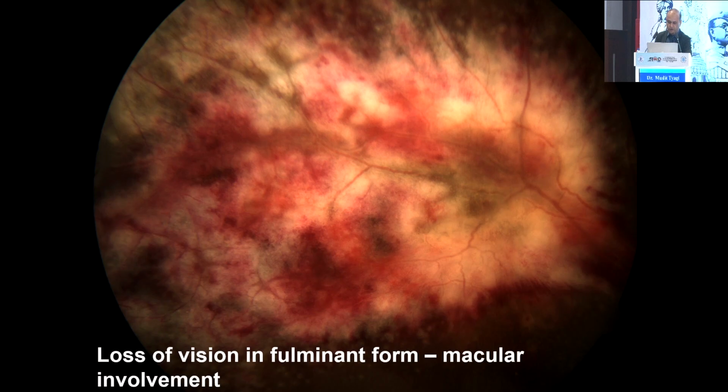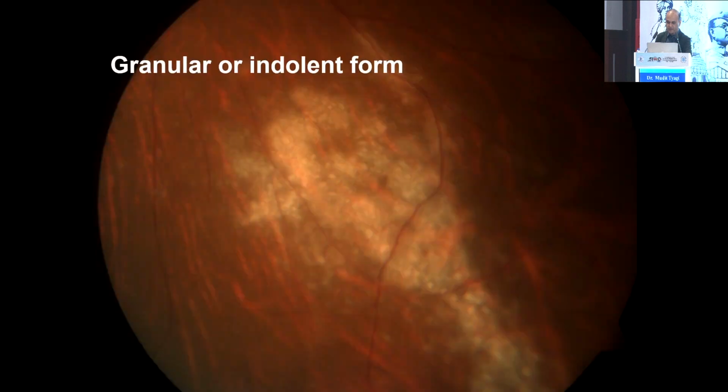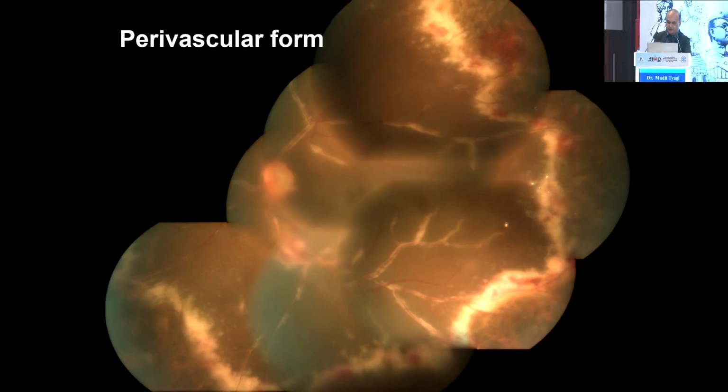And remember, the loss of vision in fulminant form of CMV retinitis is usually because of macular involvement, whereas you may have a granular or indolent form, and these patients need to be followed up carefully because they are the ones who will end up having a peripheral necrosis, subsequent breaks, and are more at risk of a subsequent rhegmatogenous retinal detachment. So perivascular form, or what is called a frosted branch angiitis, is something which we have already talked about. You see this extensive perivascular infiltration.